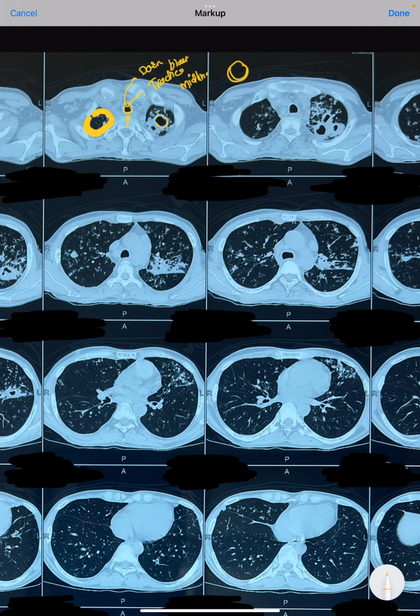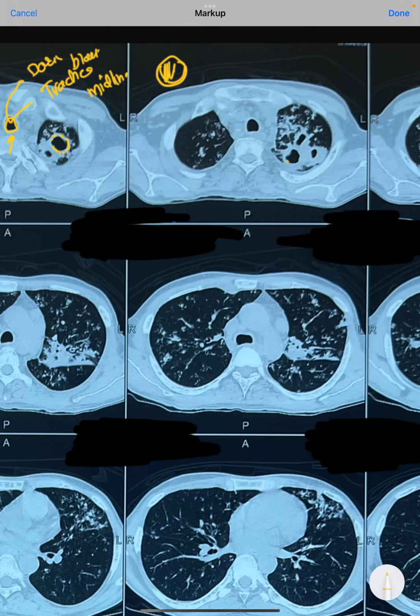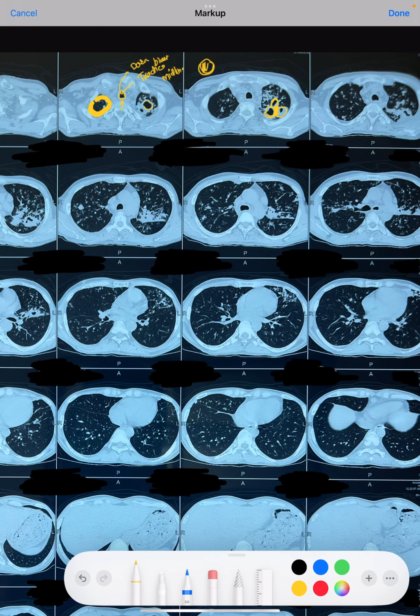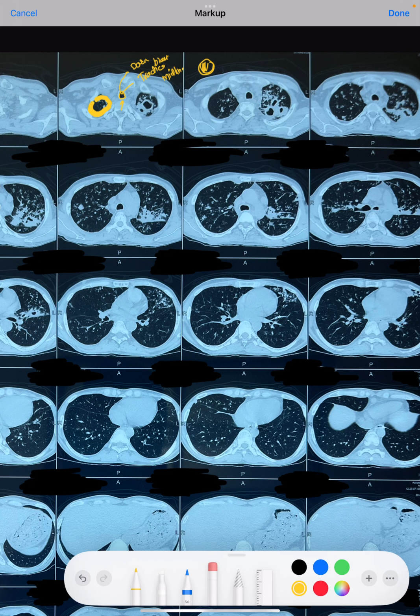There is one cavity because there is air inside, and it has a very thick capsular covering. You can see this is so thick. This is all the thick margin of this cavity. Now, we must know that the presence of a cavity means there is extensive damage of the lung parenchyma. That is the reason why this cavity is formed.